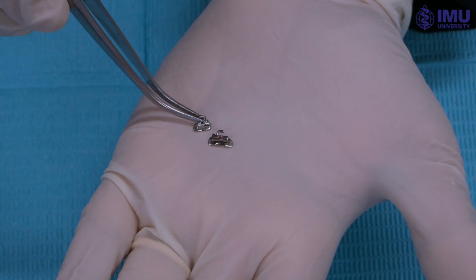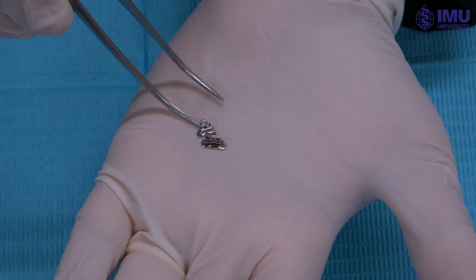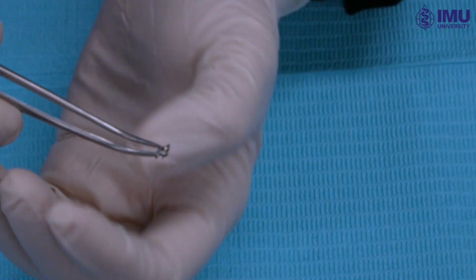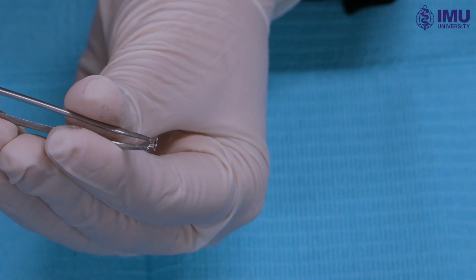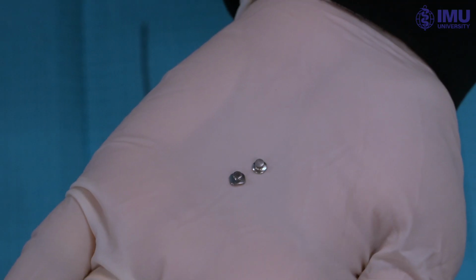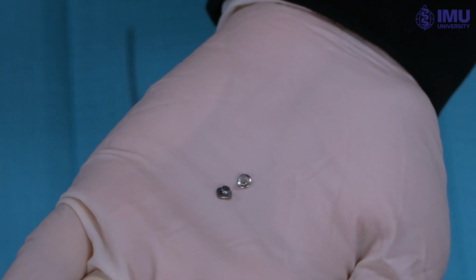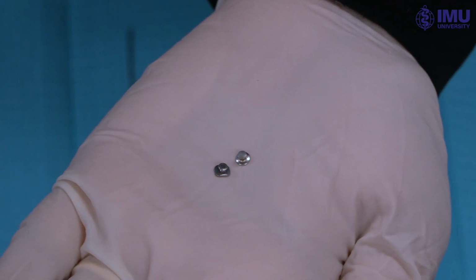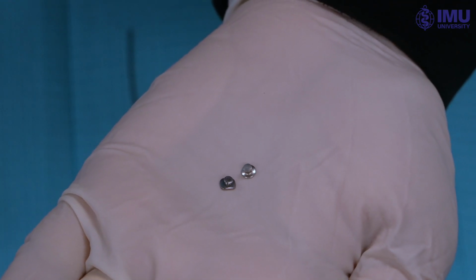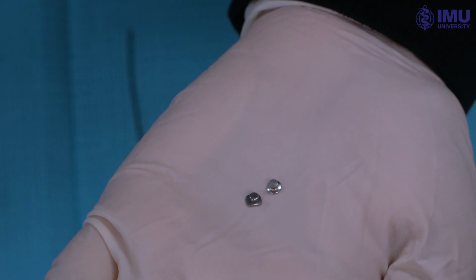Next component of fixed orthodontic appliances is molar tube, which is a passive component. Molar tube has a main arch wire slot through which base arch wire can be inserted. Lingual attachments such as lingual buttons is another form of passive component of fixed orthodontic appliances. Lingual buttons are used for attachment of elastics and elastomeric modules.